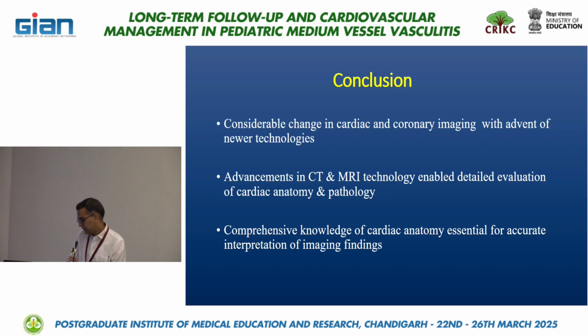But if there is some hint that there is surrounding hematoma, only then it will be differentiated from aneurysm to pseudoaneurysm. Otherwise, they are just named interchangeably. It is not 100% clear cut for aneurysm and pseudoaneurysm distinction on CT. Usually pseudoaneurysms have a smaller neck. Usually these are the small features, but in Kawasaki these pseudoaneurysms are not being reported.